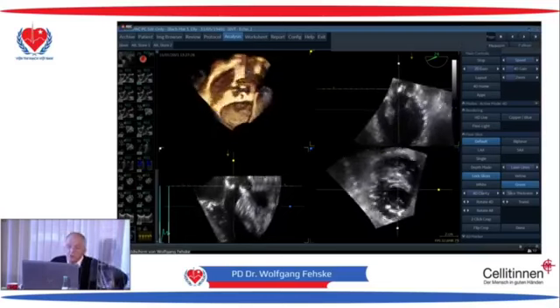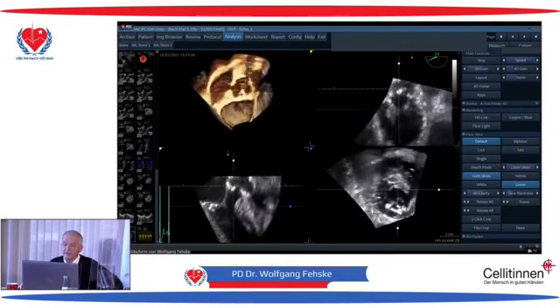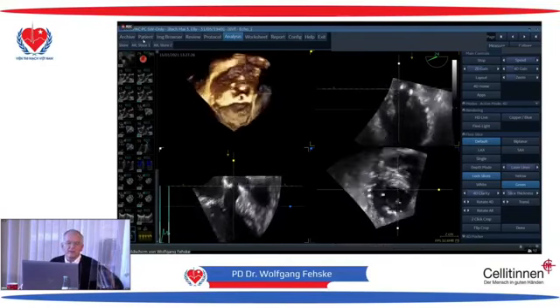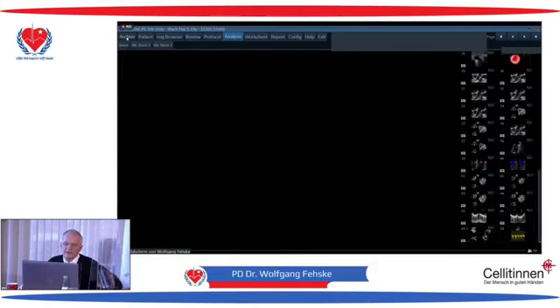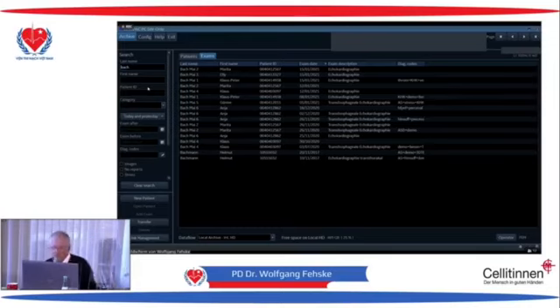Okay, so this would be the rest. We can go on in aortic stenosis, any kind, whatever you want, and I can show you terrible cases. I have the choice now just to, before I do it with the mitral valve. Mitral valve is easy. It's not easy. It is hard to quantify, but it's easy to diagnose in my eyes. I will just go one case.